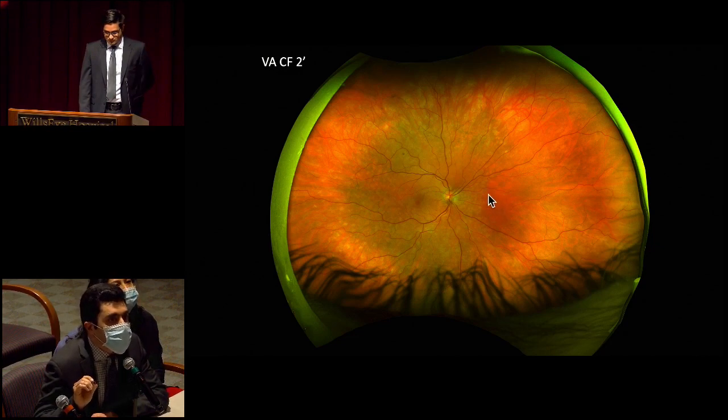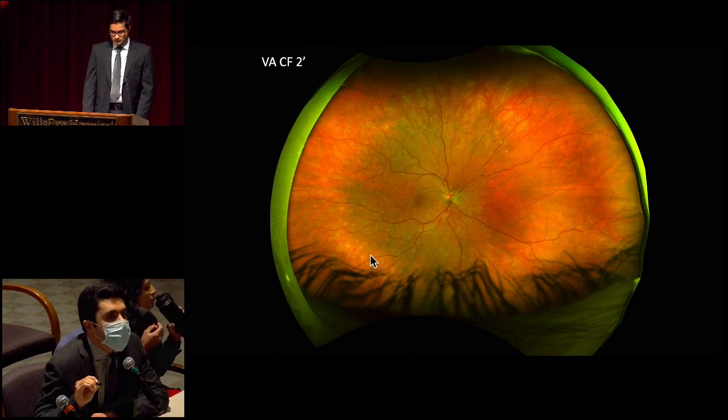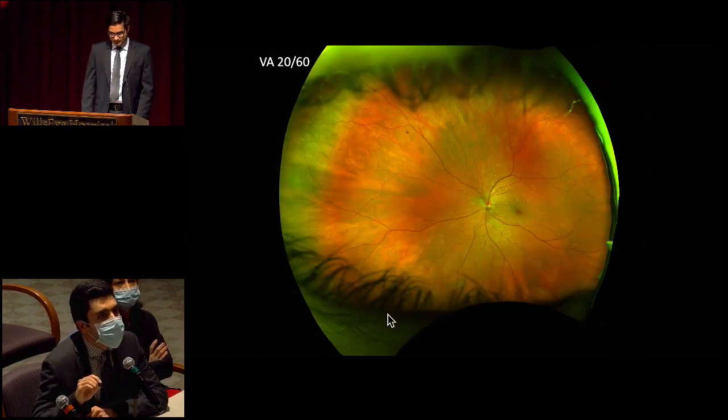And our attention is drawn to the posterior pole, where we have this area of what appears to be diffuse hyperpigmentation of the posterior pole, and within it we can appreciate these foci of yellow, white, deep lesions, either deep retina or choroid, within this area of hyperpigmentation and slightly passing the hyperpigmented area. Great. Thank you. And the left eye.